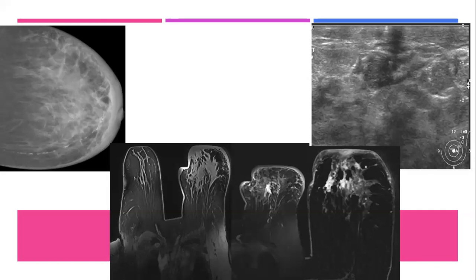Or it is invasive. Yeah, invasive cancer. It is invasive cancer. It could be invasive ductal, it could be invasive lobular. But it is invasive cancer. It's okay.